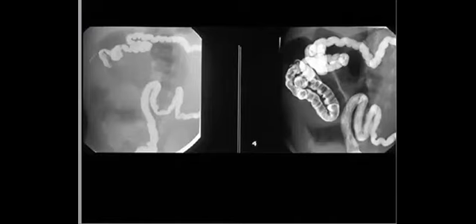Perfect. That's what I need you to know, either in the image or the MCQ, which is much more important. Which one is associated with cystic fibrosis? You can say that almost all cases will be with cystic fibrosis. Meconium ileus. So meconium ileus is the one with cystic fibrosis, the one with multiple filling defects because of the meconium, and the one in which the contrast will reach the ileal loop.